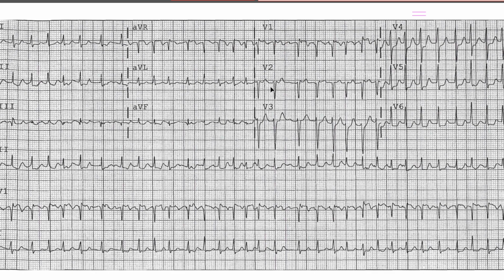Moving over to the precordial leads, I'm looking at R wave progression here, and the R wave is barely visible, but it does transition from a predominantly S wave to this sort of equiphasic state in V4. So the transition is happening really in V4 itself, a little bit late, but it's not per se indicative of anything grave at the moment.